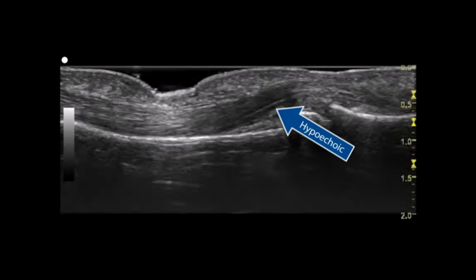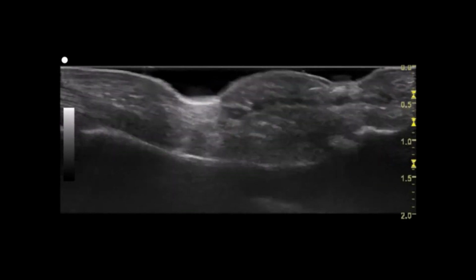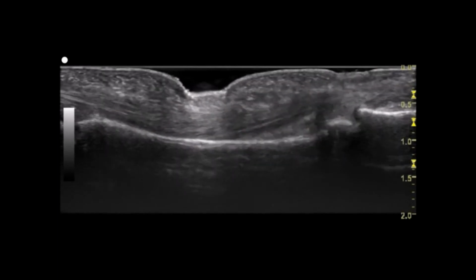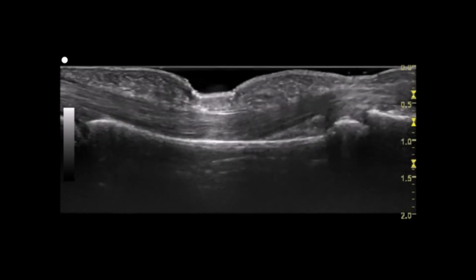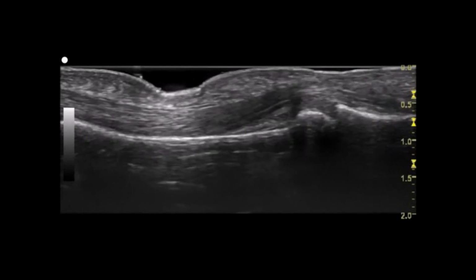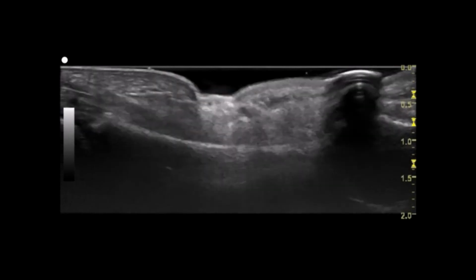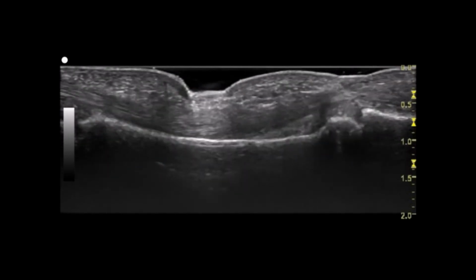As an ultrasound signal interacts with multiple parallel interfaces, such as those encountered in tendons and ligaments, the signal may be reflected away from the transducer if the angle of inclination is not directly perpendicular to the structure. This creates anisotropic artifact, an apparent area of reduced echogenicity that can be misinterpreted as a pathologic defect in the structure of interest. Anisotropic artifact is most often noted in tendons and ligaments, but can also occur with muscles and nerve imaging.